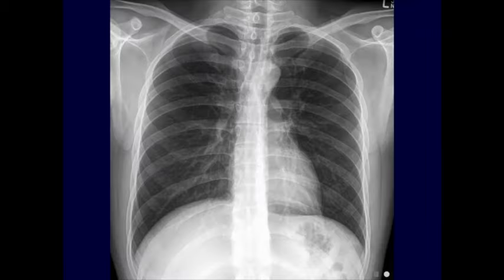And if we look at a normal chest x-ray, we can immediately apply this basic knowledge. Although these structures are overlapping, and any point on the x-ray is a reflection of all of the materials between the x-ray source and the film at that particular location, you can still identify the radiographic densities. The lungs are filled with air and show up as very dark. The bones are denser and show up relatively brighter. Soft tissues are slightly less dense. And there are even a few places on the x-ray where you just see fat and are relatively low density.